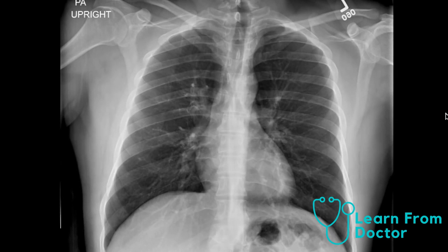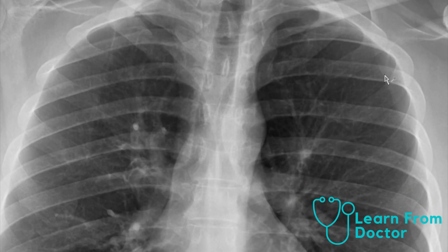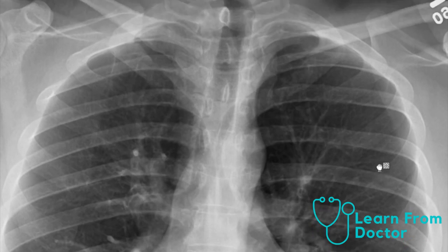this one. So the next thing I do is go straight to the lung apices. I'm trying to rule out a pneumothorax, as that is one of the most important things you can see on an x-ray. So what I do is I zoom in real closely to the lung apices. I make sure there's no fine linear pleural line up here that would indicate a pneumothorax. There isn't on this patient.